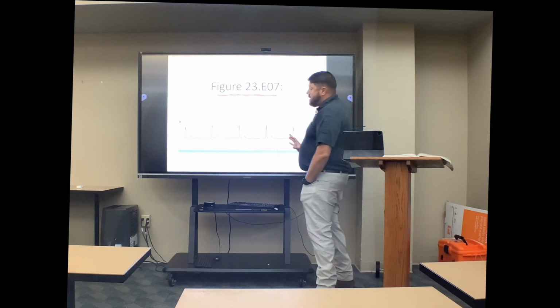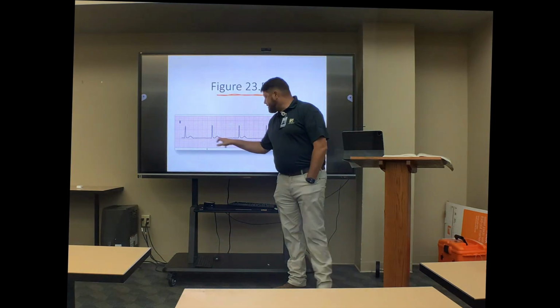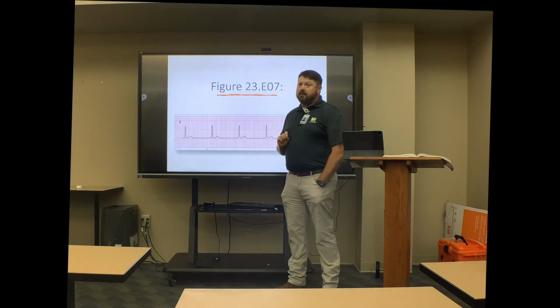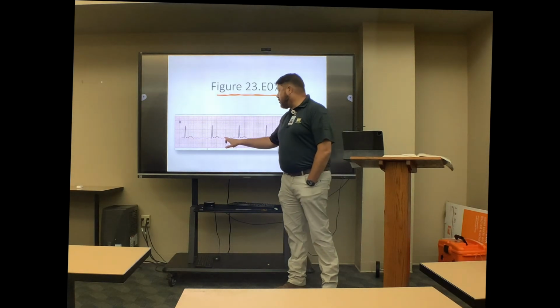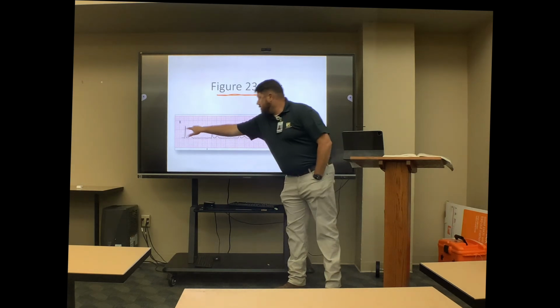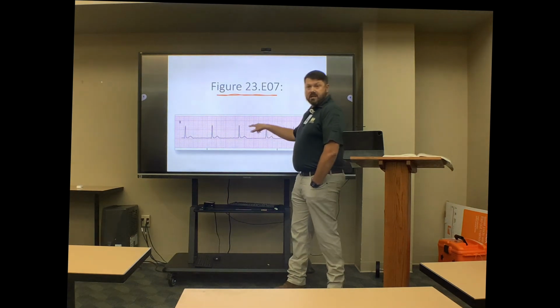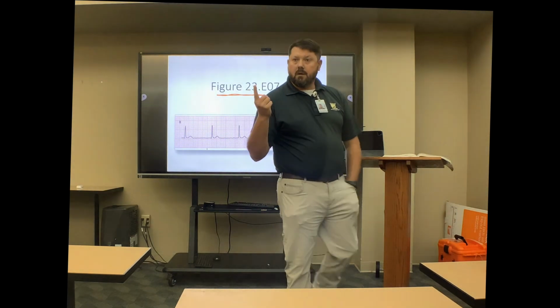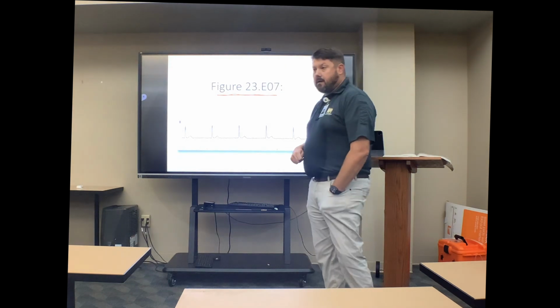Don't get confused now. What does this kind of look like? AFib. Not VFib, AFib or fibrillating baseline. But what is the first thing that you see on here that makes this not AFib? It's regular. What is the first rule of AFib? Irregular. Is irregularly irregular. All right.